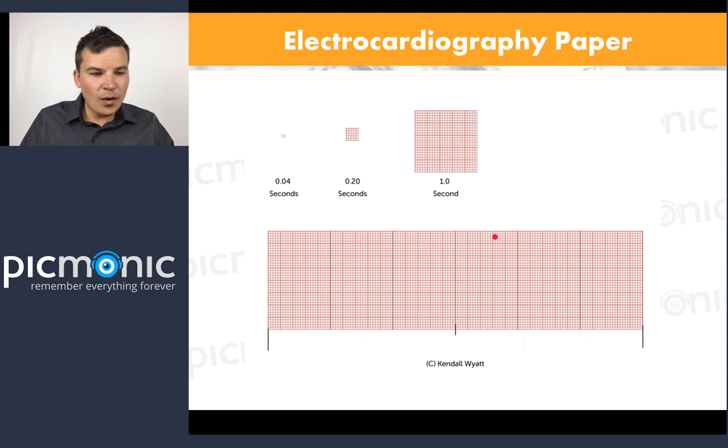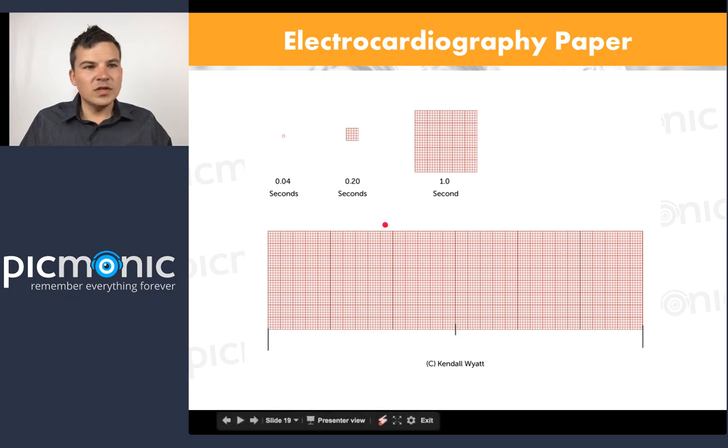Well, how can you do that? Well, see these bolded lines? All of the ECG paper is bolded inside of here, and it counts across over the lines. So that's 5. That breaks it up into 5. And then there's an even bolder, darker line for another multiple of 5. And that's absolutely correct. So you can just go from here and then go over to the other multiple of 5. So that's just where it works.